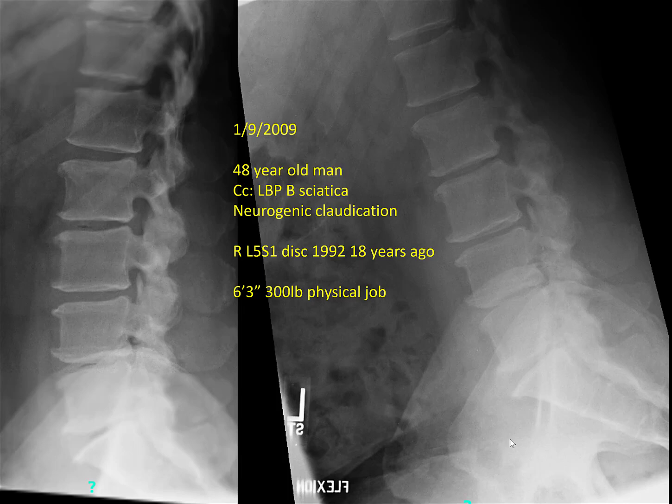So do you want to ask any questions about anything else for him? No. History? Okay. So here, what do you think of the x-rays? This is a lateral and a flexion view on the right. What are your thoughts? He's got loss of L5-S1. Yeah, so the L5-S1 disc is flat. I mean, 4-5 is flat too, right? 3-4 is somewhat flat, mildly. There's a vacuum sign, small anterior osteophytes, and on flexion view, what do you think? Spondylolisthesis? No, very stable, right?